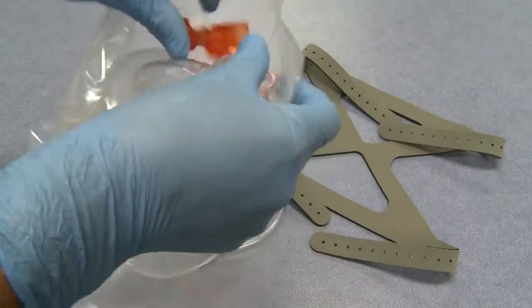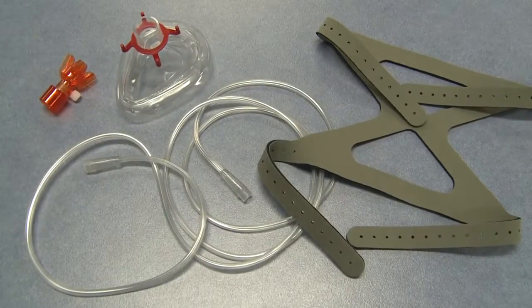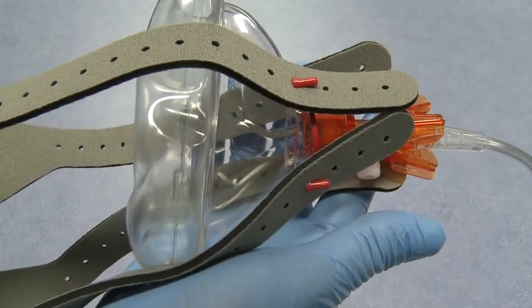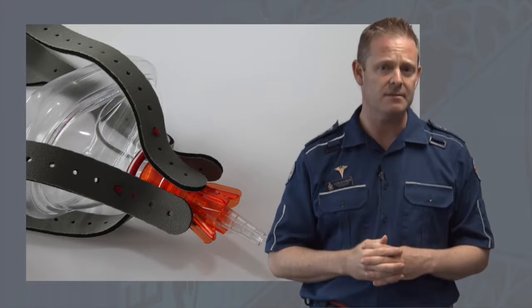It is single use only, therefore fully disposable. It has a minimal number of parts, therefore it's quick and easy to assemble. It uses standard pieces of equipment and no need for manometers and additional flow meters. Because we only use a current 15 litre flow meter, our oxygen consumption rates are very low.